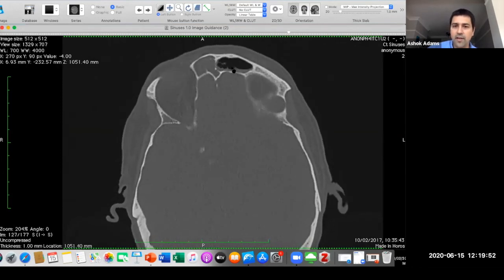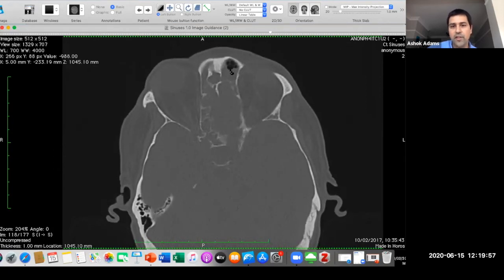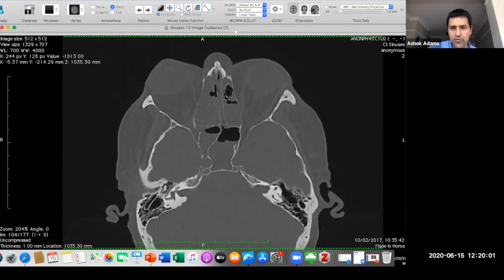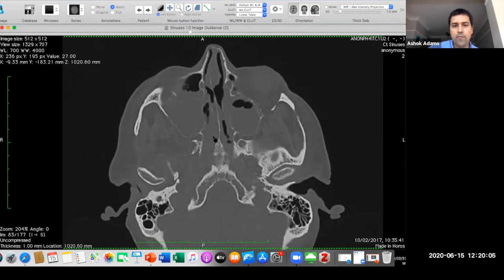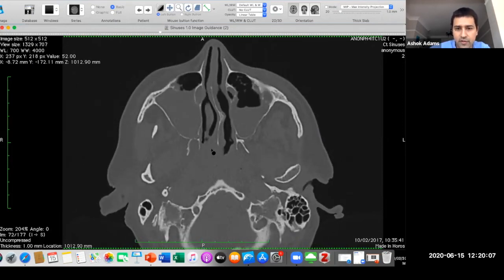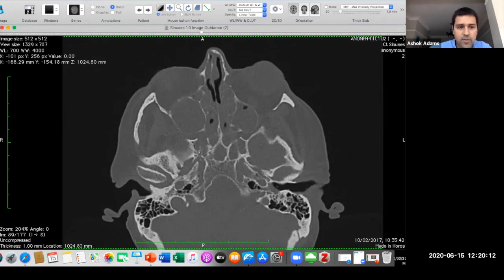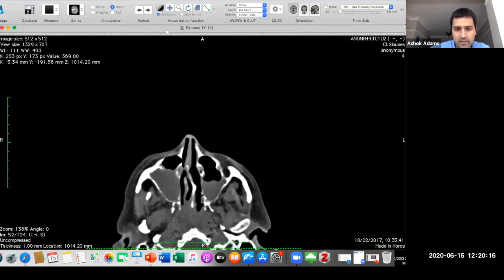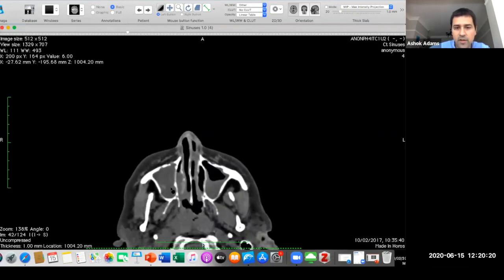You can see here, particularly when there's active inflammation, radiologically you'll see these bubbly secretions, potential fluid levels. So everything looks fairly banal so far, but you need to be very wary with invasive fungal infections. One of the misconceptions is that the sinus contents should be hyperdense, but that's not always the case. So you can see here there's possibly a fluid level, there's opacification.